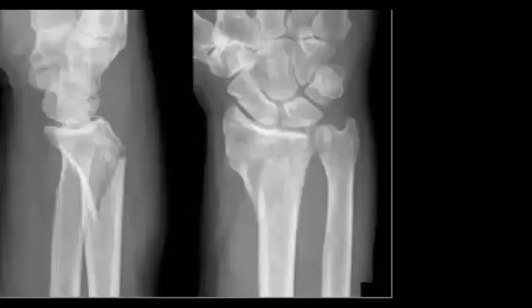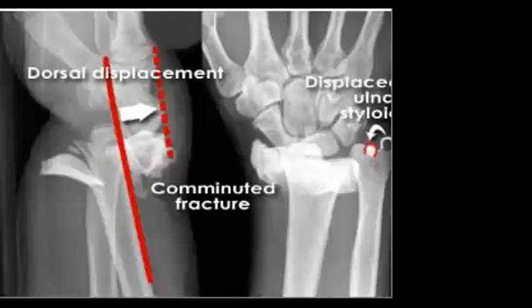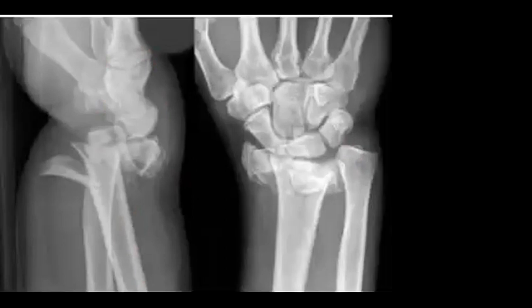And we saw already very subtle cases of radial fractures. So for you, this one will be very easy. And they like to say that maybe there is palmar or dorsal angulation. And to mention also if they reach the articular surface or are comminuted, like this case. So here they show you that it can reach the articular surface or be comminuted, as in this case. So distal radial fracture with comminution.